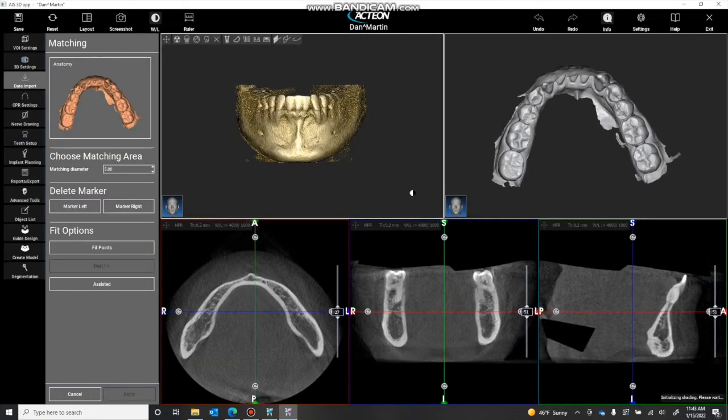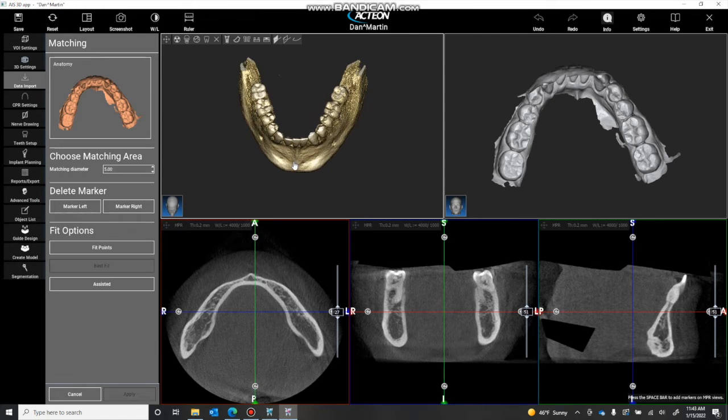And now we have them side by side. So what we're going to do here is adjust that contrast. Make sure to click out of it. We're going to lower this some, and I just want to put a series of points. So I want to match some points here that match to here. So we're going to just left click here, left click here, left click here, and we'll click here.